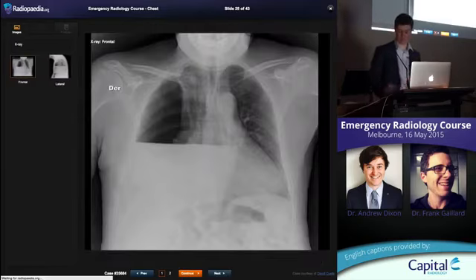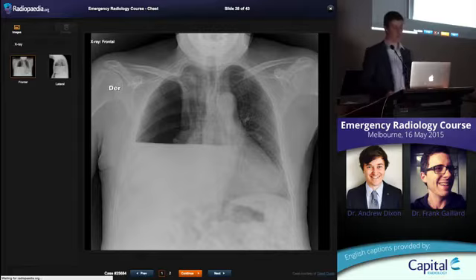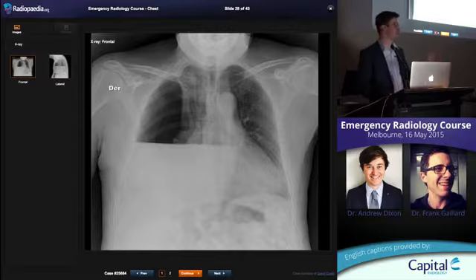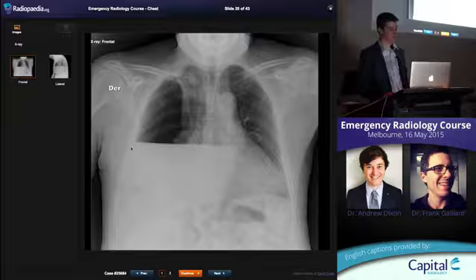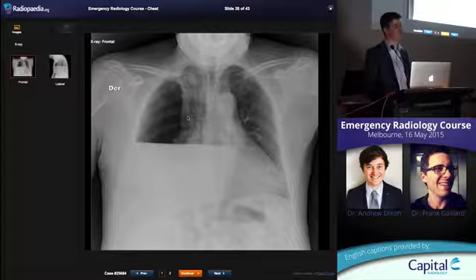Aha. So here's thinking back to my son and his layered fluids and the air fluid interface at the top. Perfectly straight line inside the human body is a fluid or an air fluid level. Okay. So here you've got lots of fluid in this right pleural space. You might call it a pleural effusion, but because it's a perfectly straight line, you know that it must be an air fluid interface, therefore there must be air in the pleural space. Therefore, this is a hydropneumothorax, okay?